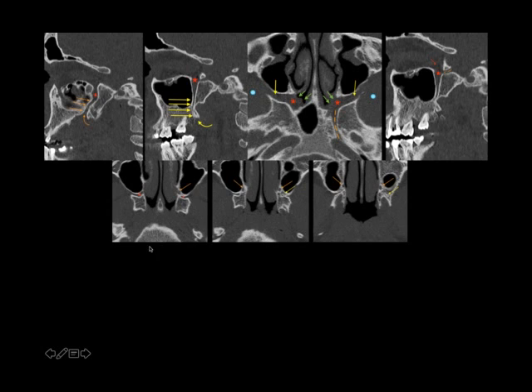These are the ones which I said, the greater palatine foramen, which is along the medial wall of the maxillary sinus and the lateral wall of the nasal cavity. Try to reconstruct them, and this is the lesser palatine foramen. So they are closely placed. Lesser palatine is not so important, but the greater palatine foramen is very important, because that nerve is larger and appreciable, and then you can document whether there is perineural spread along it. But by and large, greater palatine perineural spread is only seen on MRI, not very well seen on CT.